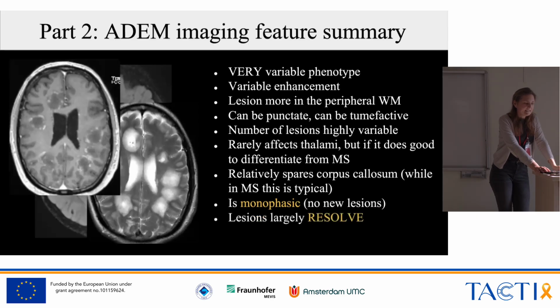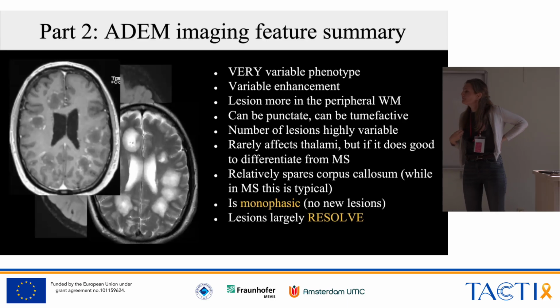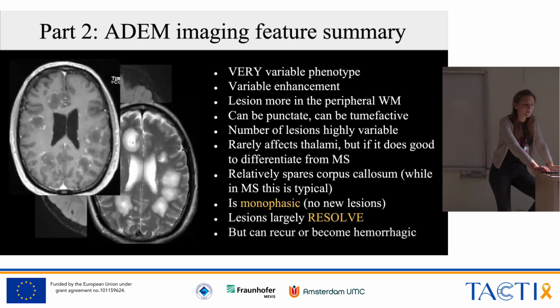And also here it's interesting to see the contrast enhancement pattern in terms of the monophasic nature. Absolutely. You see that the majority of areas also enhance after. Yeah, so they all do the same thing because they're all from the same event, more or less. And they should resolve, but there are cases where something like ADEM turns into AHEM, which is a not so frequent complication, but if it happens, there's like complicative hemorrhagic cases with a far worse outcome.